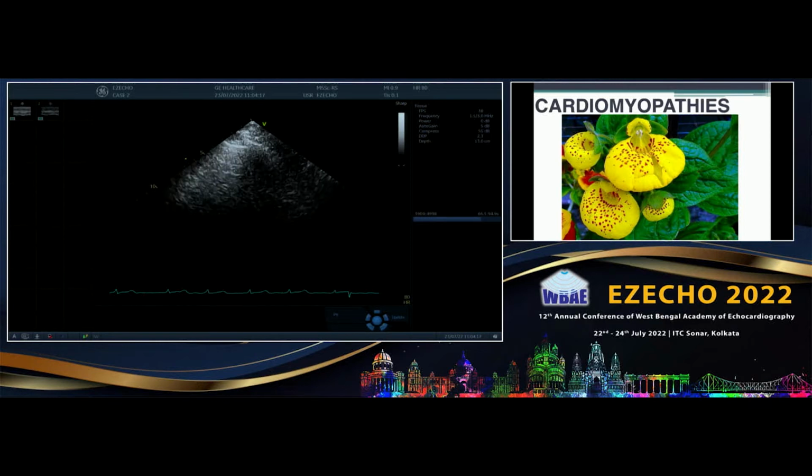That is a very important sign that tells you that there is no pleural pathology. And what happens is that this pleura continues to have reverberation here. So you get horizontal lines like this going down, and that is the normal lung tissue. The moment you have any kind of edema below this visceral pleura, you start getting the lung comets. That is the B line, and it's a very sensitive sign of pulmonary edema.